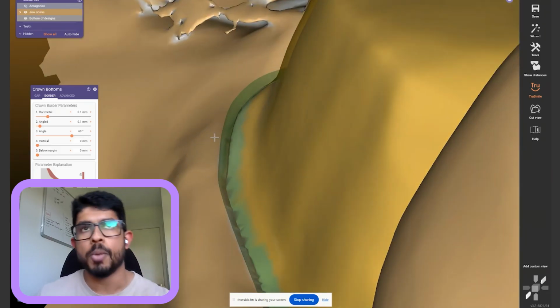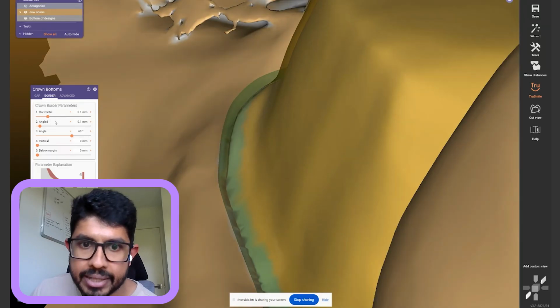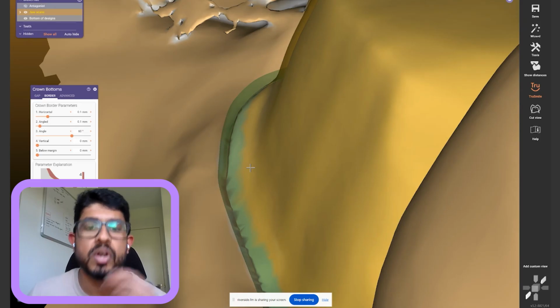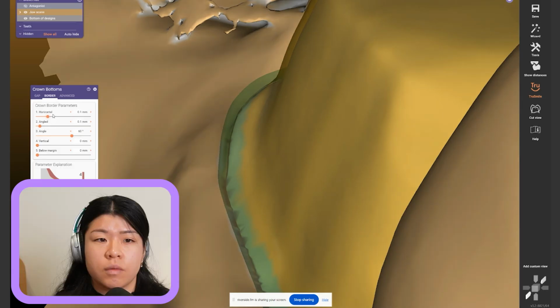And if I open up your case and we see the crown that you designed, and I simply tweak this and say okay, you will actually see how your crown shrinks at that gingival third. It shrinks and removes all that overhang much nicer. So this is the only thing that I go ahead and tweak, and that's something that I want to point out to a lot of people.